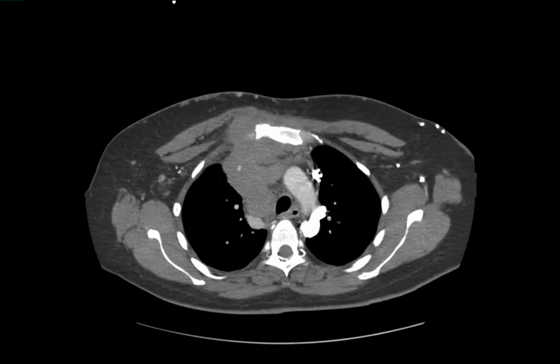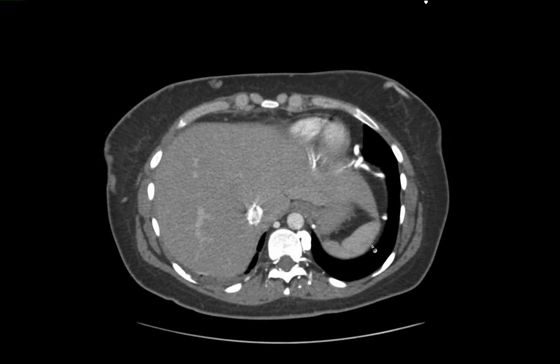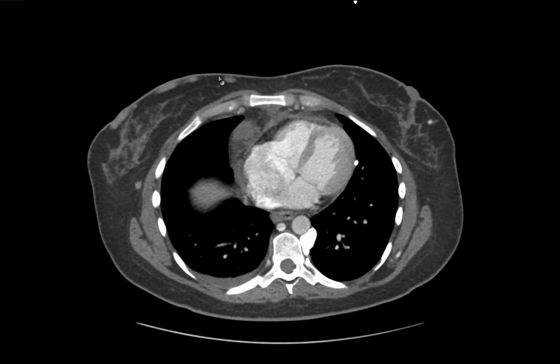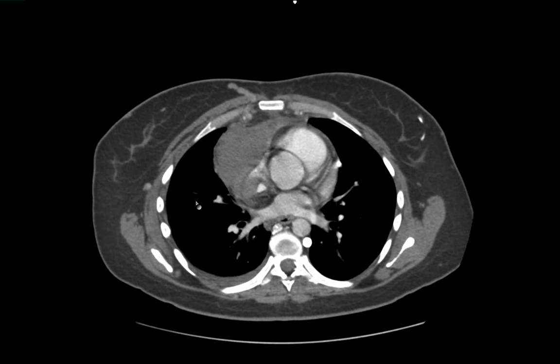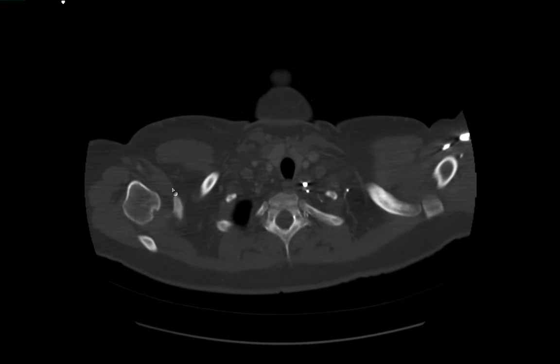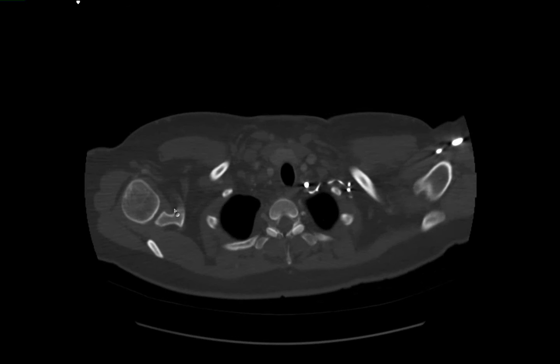Of course, it's a nice example of the superior intercostal vein, a nice example of the pericardiophrenic vein, a nice example of periphrenic veins crossing the midline, heading towards the inferior vena cava, and all the other pathways. And all these really big superficial veins there. How about the bones? Do you see any of those little sclerotic fake outs that we've seen recently? Because it looks like there are some intervertebral, paravertebrals and intervertebrals in the usual way, rather than the intravertebral ones, right?